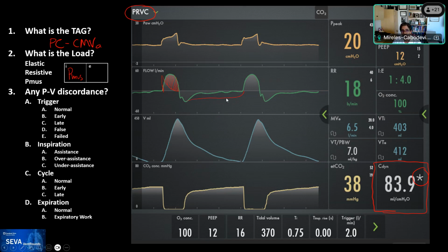Usually when we think that there's PMUS, it's a little bit more tonic, but sometimes the patients can relax and continue to go. And so you get these little divots of relaxation. So it's suspicious for us. Yes, Megan, we're going to talk about that in a second. But the expiratory, these oscillations that we see here are very regular.